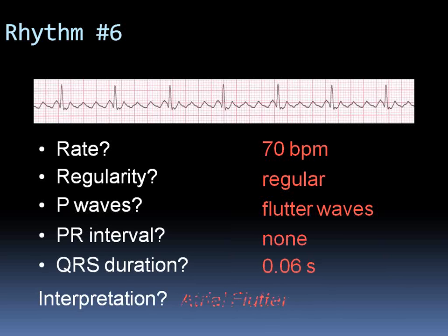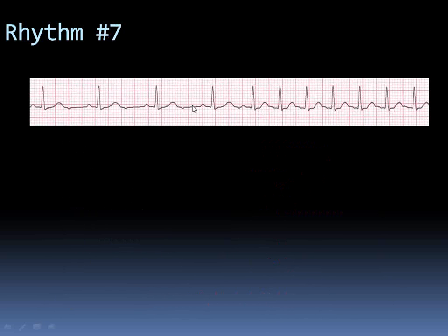All right. Now, what do you guys think is going on over here? We went over this ECG also before. See how this is sinus over here, and all of a sudden it speeds up. Good.